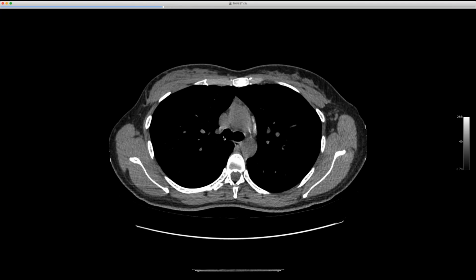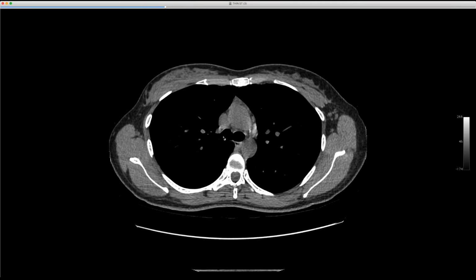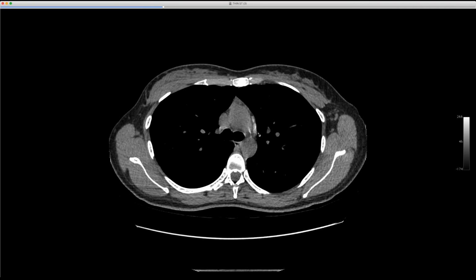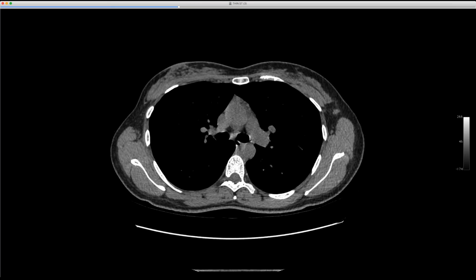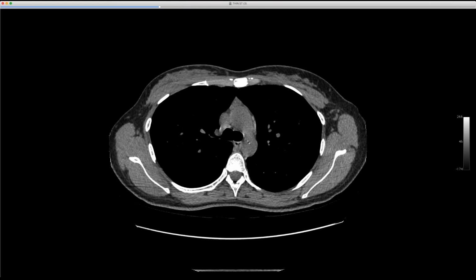This woman was from South Central Asia, so sarcoid is very uncommon in that population. So with that occupational exposure, this is probably the lungs doing what they're supposed to do, and that's clearing the dust, and then she's getting a granulomatous reaction to it without developing parenchymal disease. And it's the only time I've seen beryllium disease with presumed berylliosis without lung involvement.